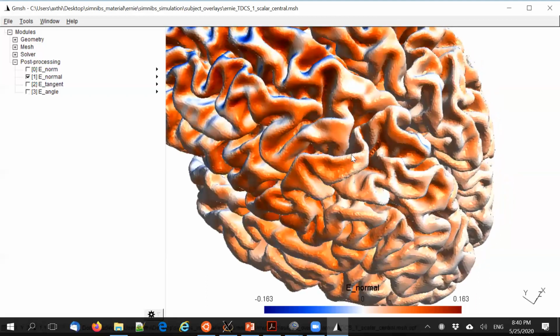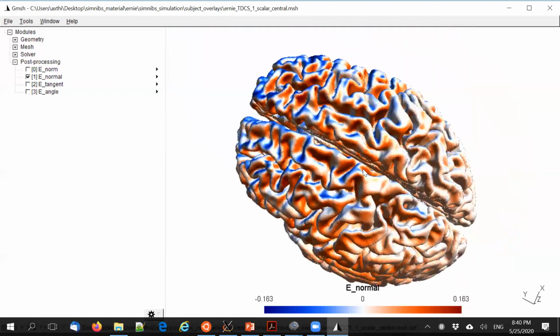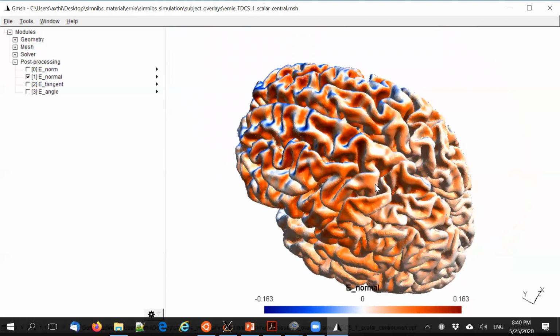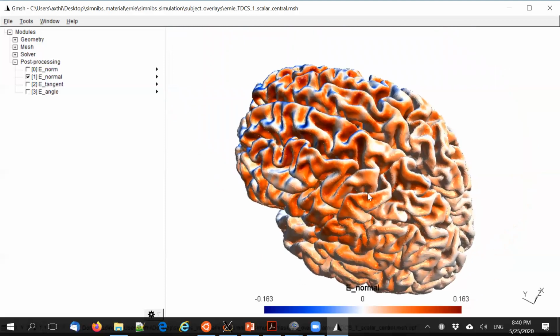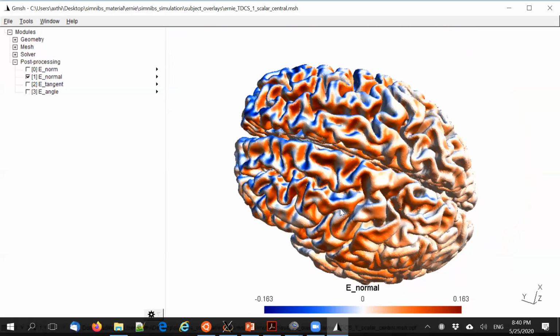And this might also explain why these montages achieve their physiological effects, because in your target area, your area of interest, you have a fairly consistent stimulation with one polarity, which then hopefully creates some kind of specific physiological effects. You also see that because you have this current flow from here to here, you have a clear-cut red, blue, red, blue, red, blue pattern.